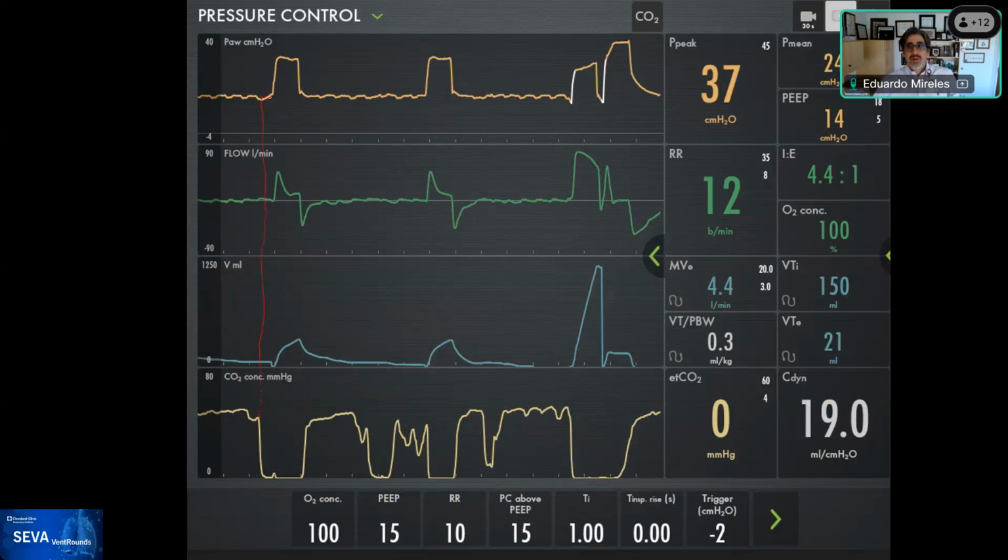So you see how the pressure dropped? And it goes with the inhalation that you see in the end-tidal CO2. You can kind of see it, but because now I have normalized the flow gain, it's in auto gain, you cannot see it, but the patient effort started here. So what type of trigger is this one? What's the problem with this one? Yes, Miguel, this is a late trigger. Exactly. So now it's a late trigger.